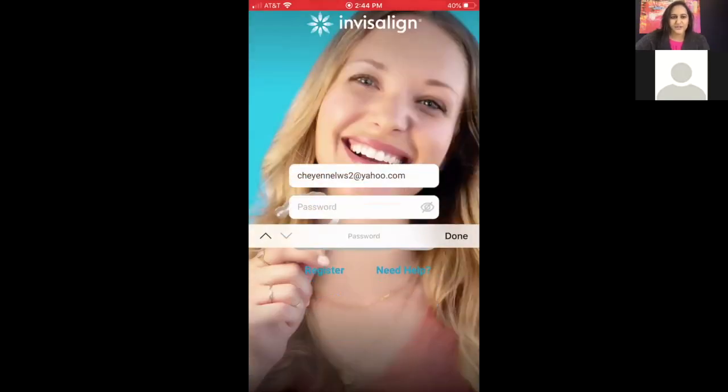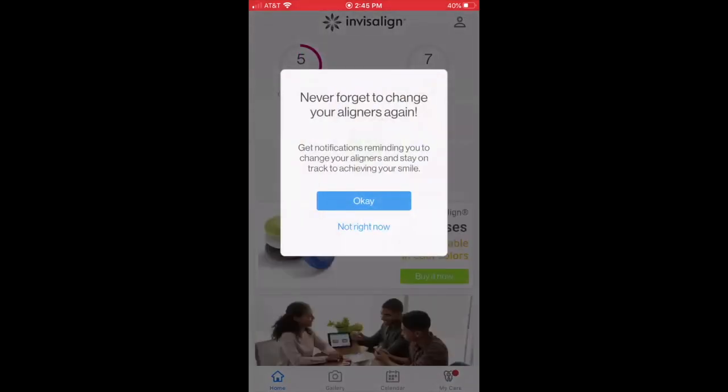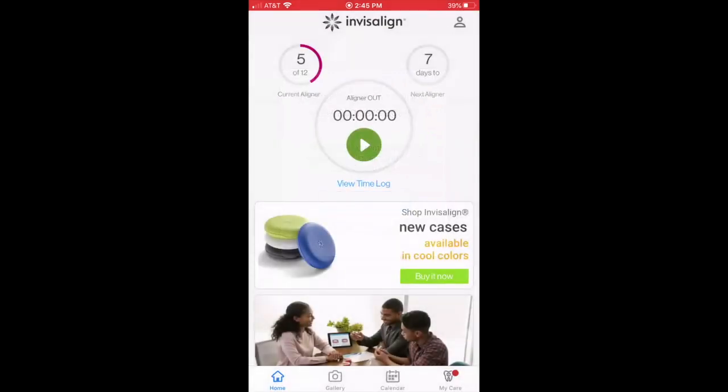Okay. So you're logging into the app. Okay, and this is the notifications. And this is the beginning.